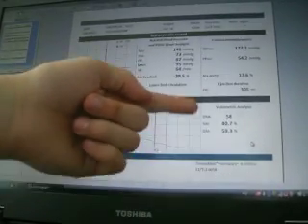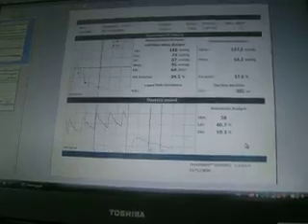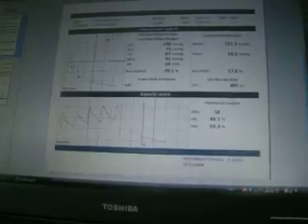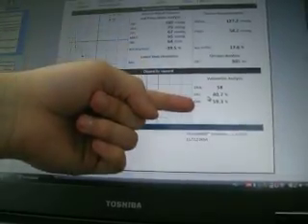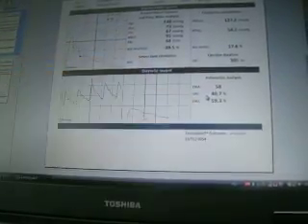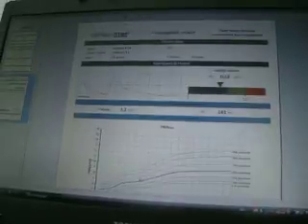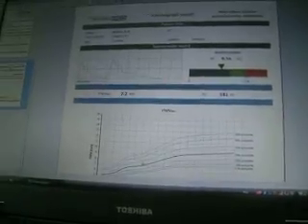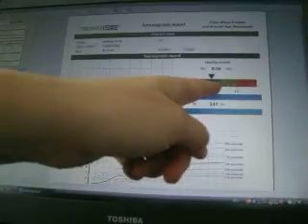These three altogether are called cardiac fitness parameters and show you how the coronary perfusion is for that particular patient. The higher the DRA and DAI numbers are, the better the coronary perfusion is, showing a good condition of the coronaries or the heart itself. This is a quality control index. It should be in the green area.